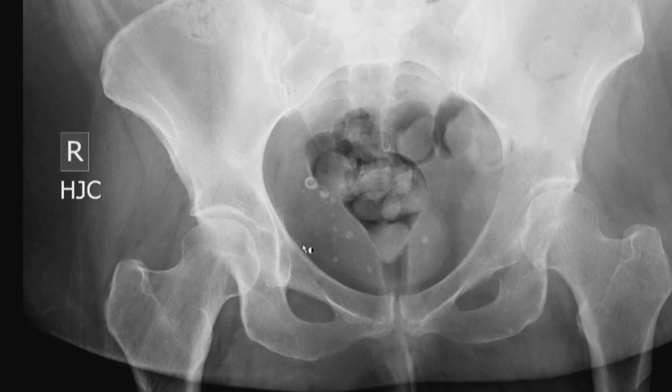There was no pathologic fracture, at least identified by radiography at this time. There is a grading scheme to help determine whether acetabular tumors place patients at increased risk for impending fracture. However, it's my personal practice and the practice at my institution to state that pretty much all of these place the patient at increased risk of pathologic fracture, and these patients are routinely referred to orthopedic oncology.